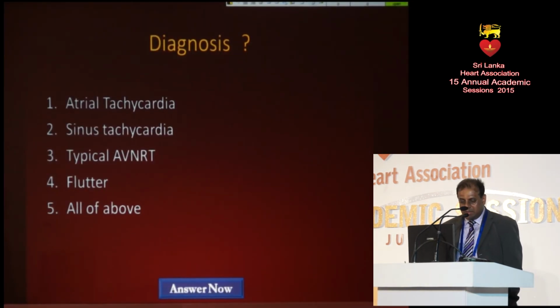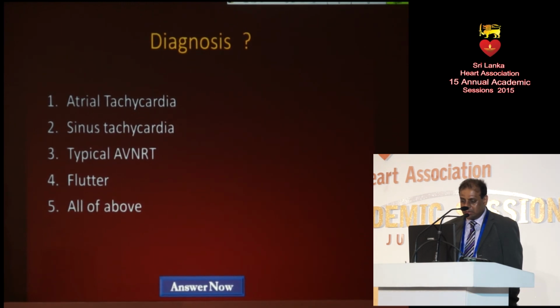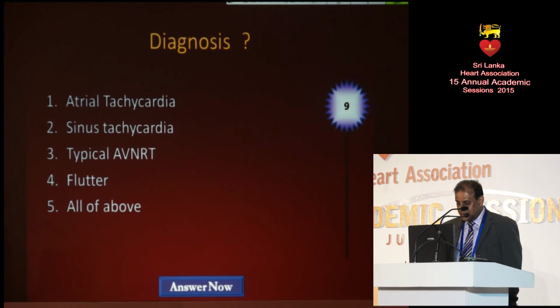What's the diagnosis? Is it atrial tachycardia, sinus tachycardia, typical AVNRT, flutter, or all of the above? You can start voting now. Go to the last 10 seconds.